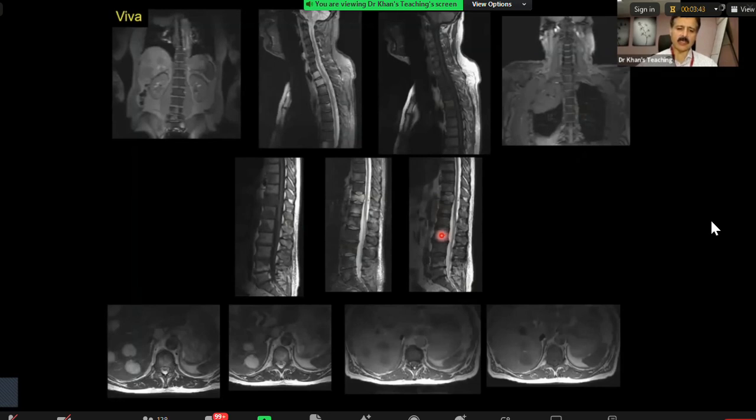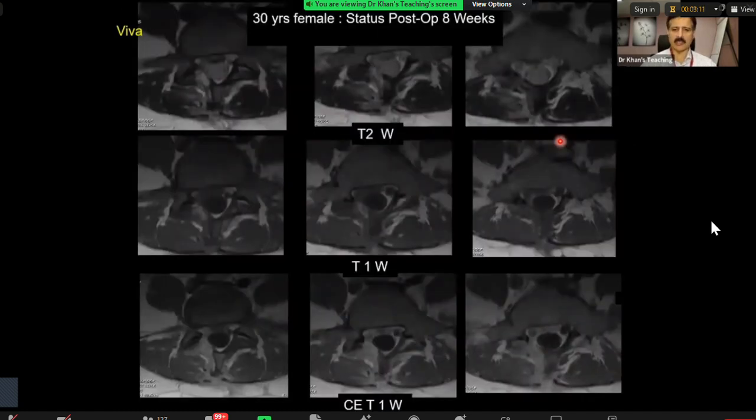But then on the available sequences, you can see multiple lesions in the liver. So metastasis there. And then on the SCOUT, you can see that there is a lung carcinoma, means that is the primary. So always look for multiple findings. So in the spine, for example, you are looking at the cord and something might be sitting in the brain. Or if you go to parasagittal and something might be visible on the lung. So that is what is checked in the exam.